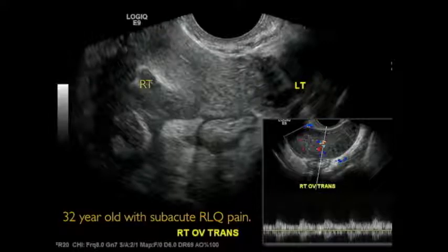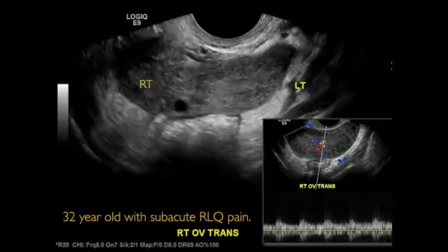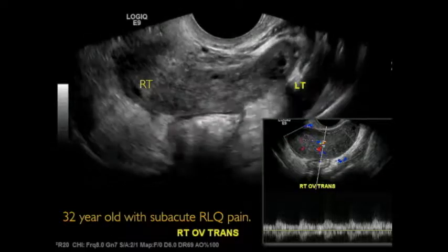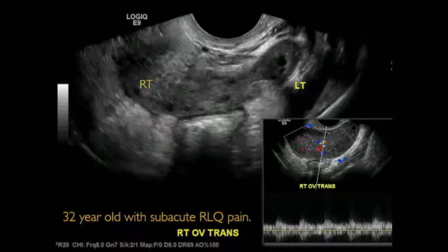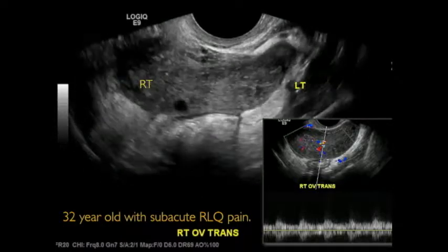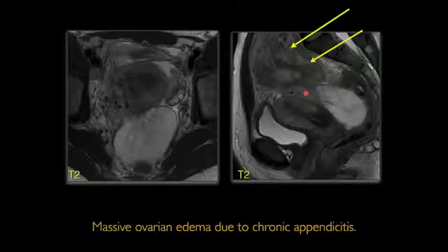A very similar case of massive ovarian edema. This was a 32-year-old with subacute right lower quadrant pain. She had the ultrasound, which showed a very edematous ovary, but she wasn't really tender at all. And it was so strange. I was kind of like, well, should I get the MRI? Should we not do the MRI? And then we got the MRI, and it was quite surprising to see what we saw.